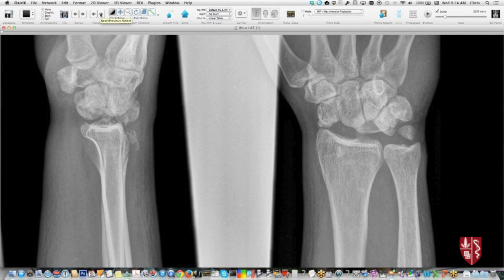Here's one that the janitor should pick up as they walk by and say, man, look at that carpal dissociation pattern, right? So if you miss this as a resident, you're probably in the wrong specialty. Now you might just say, boy, that's totally jacked up, which is probably a reasonable first approximation, because it can get really difficult to figure out what's going on with these.